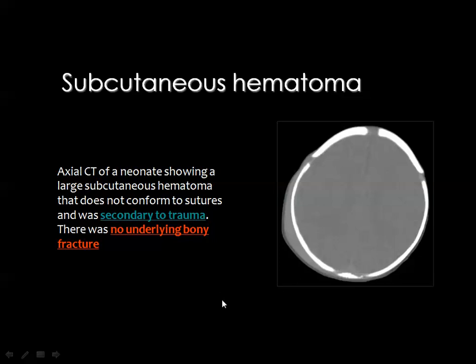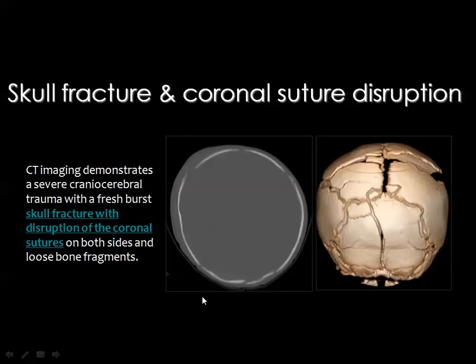And it is better to discriminate between sutures, which are usually bilateral and symmetric, from the fractures to have the 2D or the 3D reformatted images. As you can see here, this is a case of trauma with comminuted calvarial bone fracture, which is appreciated well in the 3D image.